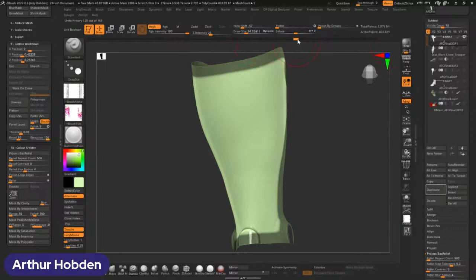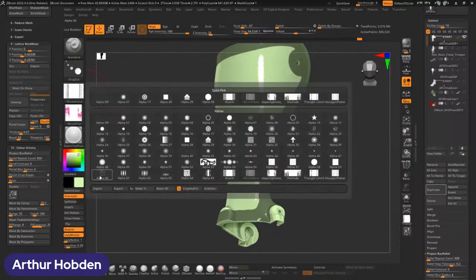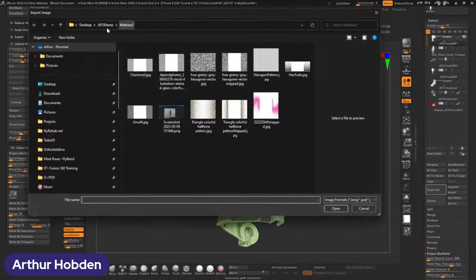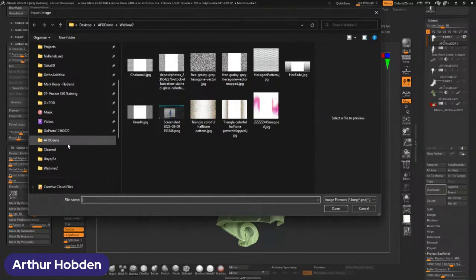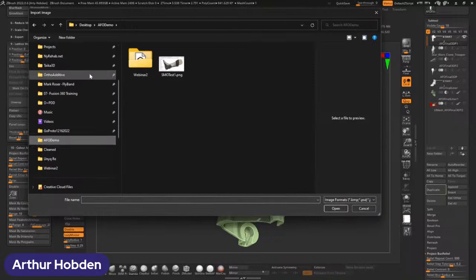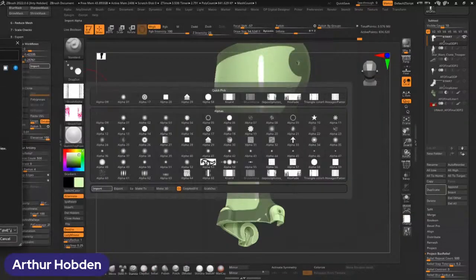So if we go back in time a bit to sort of get that group in order again, if I wanted to bring in sort of, let's see, if I go back to, I'll bring in another one. I'll give you an example here. No, hold on a second. Hold on a second. Where are you?